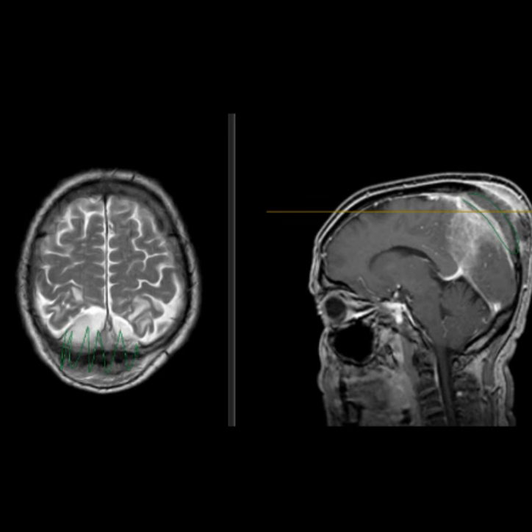My second differential diagnosis will be some sort of aggressive meningioma, for example, hemangiopericytoma, which in this case, I think it can be hemangiopericytoma because of the aggressive effect. Also, meningeal sarcoma is possible, and metastasis is a possibility. However, usually it does not present like that.